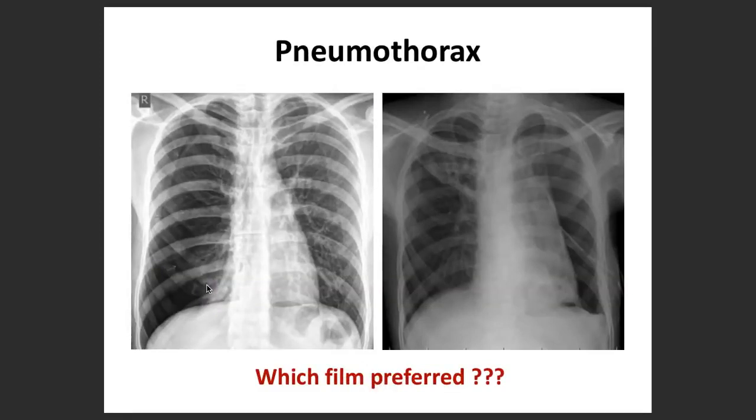So what is this one? I have already given the diagnosis. Pneumothorax. Why? Now the question comes, why is it pneumothorax? Air in the thoracic cavity, sir. Great, great. And what else?